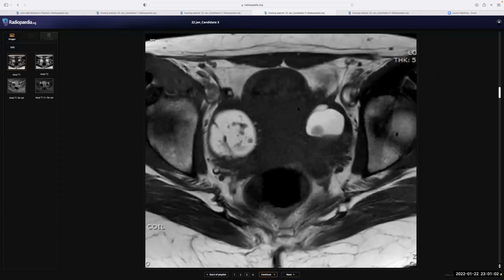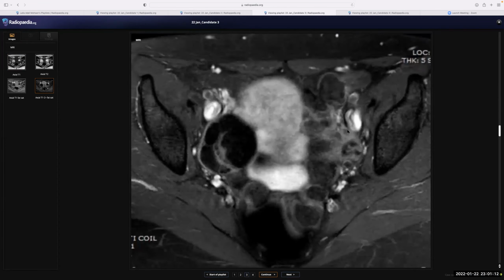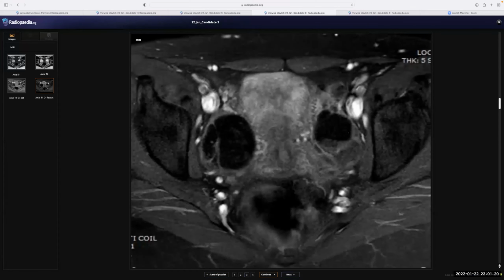Okay. And on the MR, this is a T1 case, and those are hyperintense areas that are suppressed. So these are dermoids. Continue your analysis. There are no enhancing components, so it's likely benign dermoid cysts noted bilaterally. Again, like you say, this patient should be referred urgently to the gynecological team for further management. They can cause adhesions, they can cause rupture. They do surgery for these. I think some ovarian sparing surgery is done, but these should not be left even for follow-up.